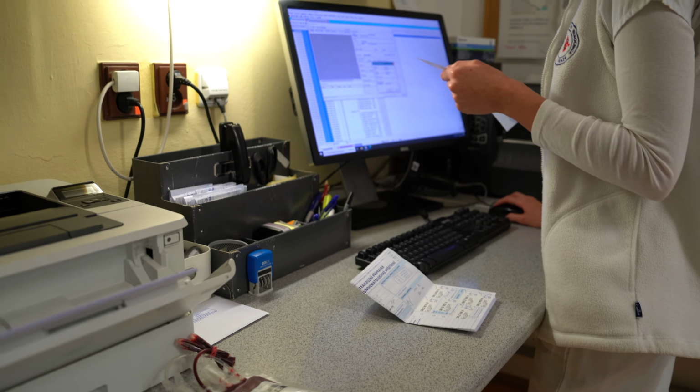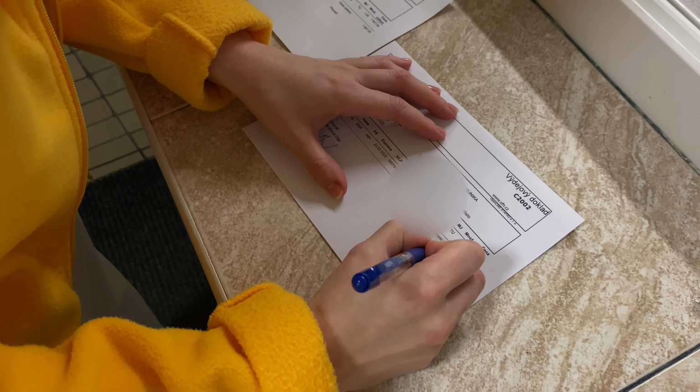The accompanying documentation includes delivery note, adhesive transfusion record label, pre-transfusion test results, the orderly signs for receipt of the product. Transfusion products are transported in disinfectable, temperature-stable containers.